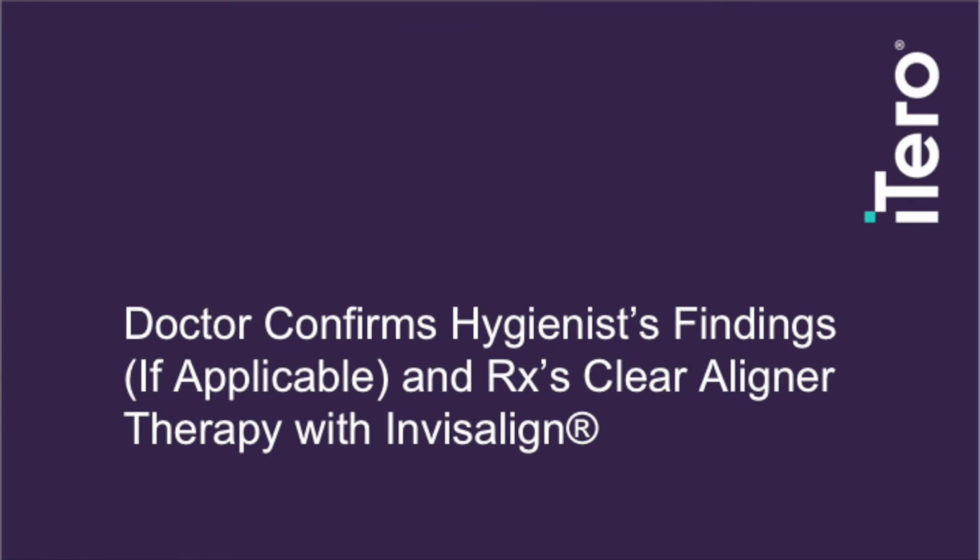Should the doctor confirm the hygienist's findings, he or she should communicate that to the patient while utilizing the occlusogram as a visual aid. Once the malocclusion is identified and understood, the doctor should run an outcome simulation to show the patient what their smile could look like after Invisalign treatment. Our data indicates that upwards of 70% of patients that view an outcome simulation accept Invisalign treatment as prescribed.